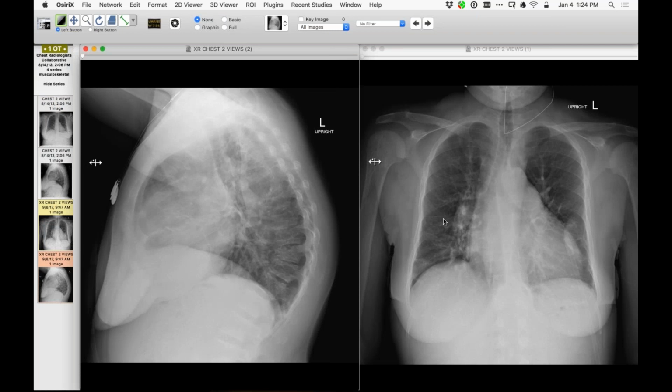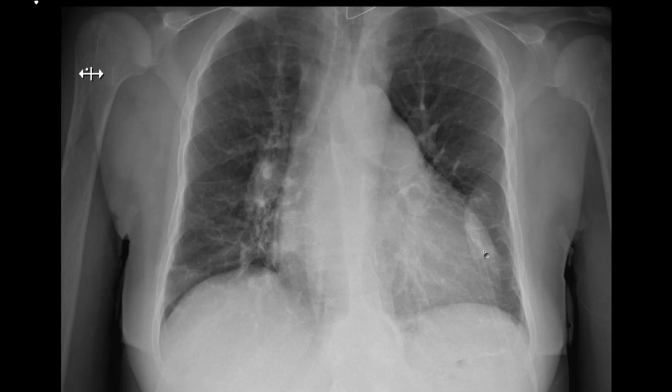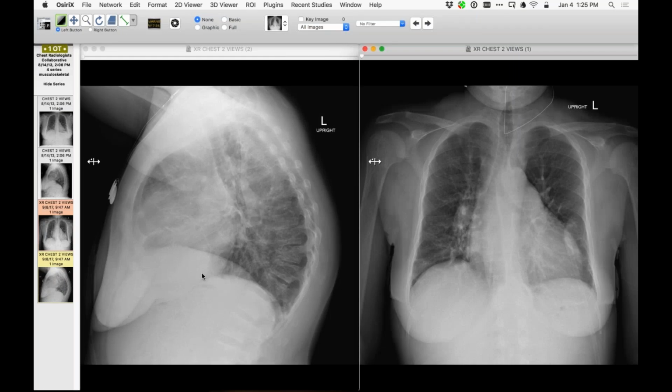Is that pleural fluid that's more inferiorly on the left? Or what's that kind of vague ovoid opacity peripherally over the heart? Let me see if I can tell whether it is something extreme. Or is it a big brown tumor or something, going in that direction? I can't tell what that is, if it's anything. Maybe it's just some atelectasis, I think.